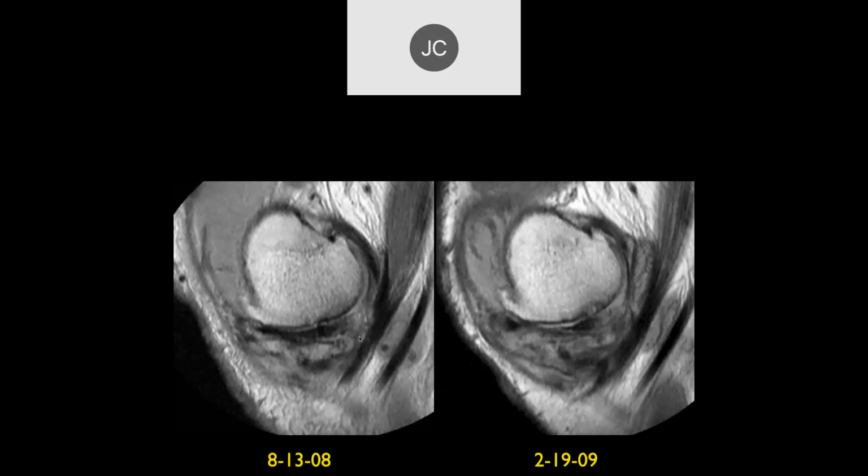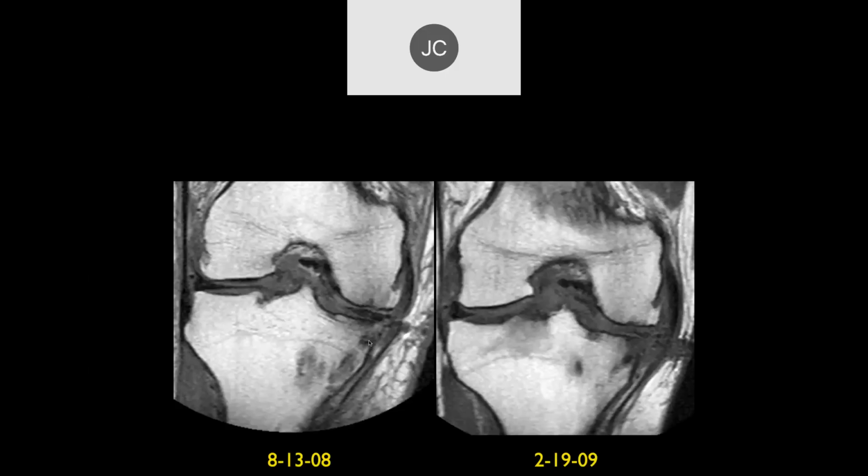And then this is just progressive degenerative disease and decreased volume of the meniscus over time, which tends to occur in these menisci. Especially, I'm sorry to interrupt. If you get to the age of 50, you're probably better off with a replacement, either one compartment or both compartments, instead of trying this technique.